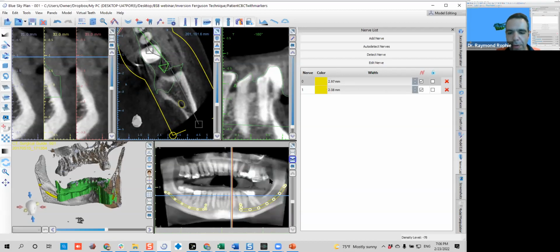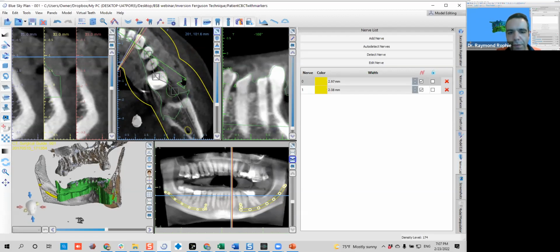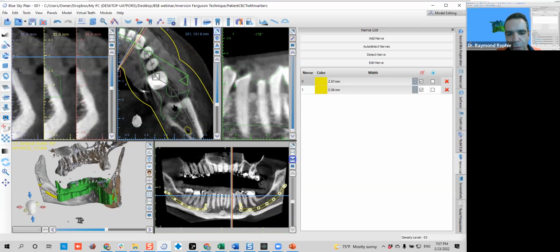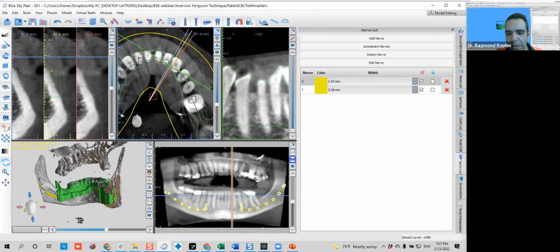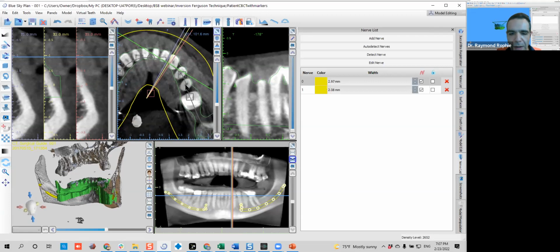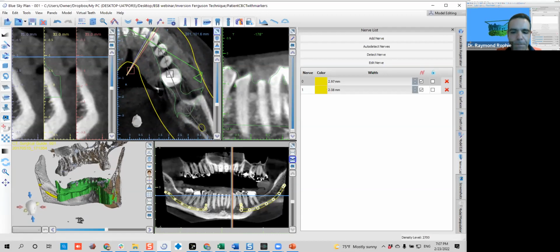And basically the panoramic view that you see here below is not a real panoramic picture as you know it. It's just a view to be familiar, but this is great for tracing the nerves. If you want to trace a nerve, you just grab these squares and place them surrounding the nerve passages. And as you can see now, you can watch the nerve easier.